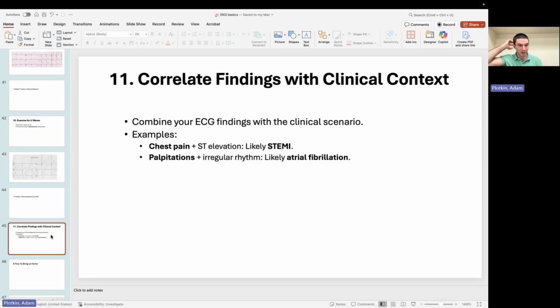This is the way I go through them. If you have a different way that works for you, go ahead and do it. The big thing I'm pointing out though is you need to be systematic about it. Every EKG should be read in the same way. I've practiced this enough times that I know exactly where I'm looking. My eyes guide me. You guys will see this when you get to chest x-rays and other findings. Your gut is always going to want to go towards the crazy finding. If you do that, you might miss another thing that would have helped you in the diagnosis, or could change your diagnosis. So keeping a systematic pattern is really going to help you.